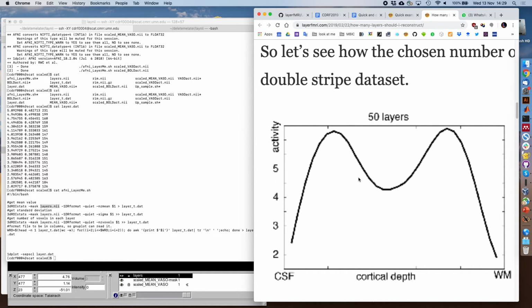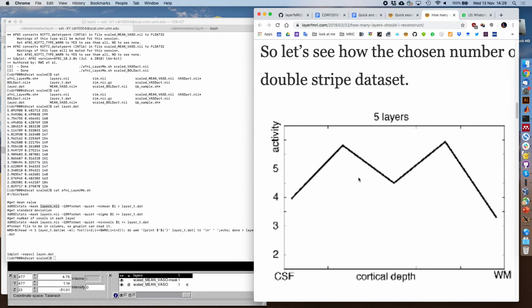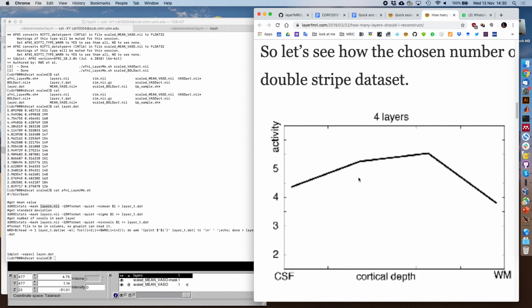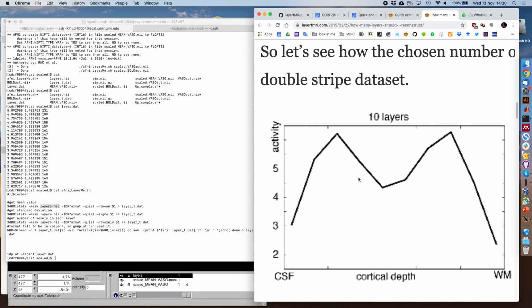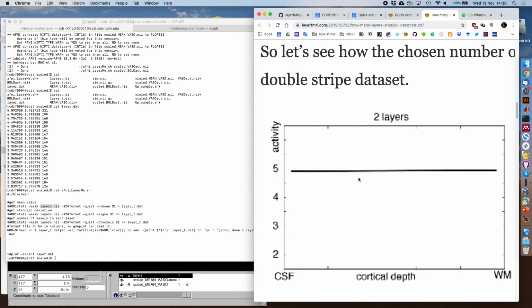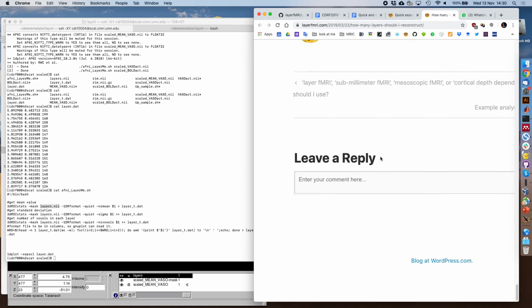Right, okay, but then that leads to the question: if in a paper, over subjects or regions of interest, I want to claim that there is the dip, what kind of metric should I report to make that claim? I can see it, but is seeing that enough, especially if I want to average over multiple subjects?